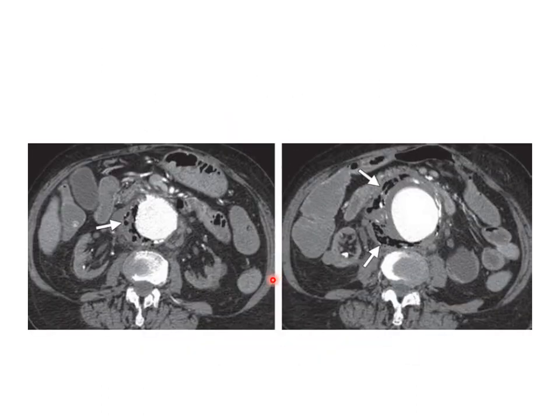Another CT angio showing a collection of gas around the thickened aneurysmal abdominal aorta with irregular lumen and thickening of the wall. Here also a collection of gas. So the important pathognomonic sign is the gas present in the wall, but we usually do not see it, only in a few patients.